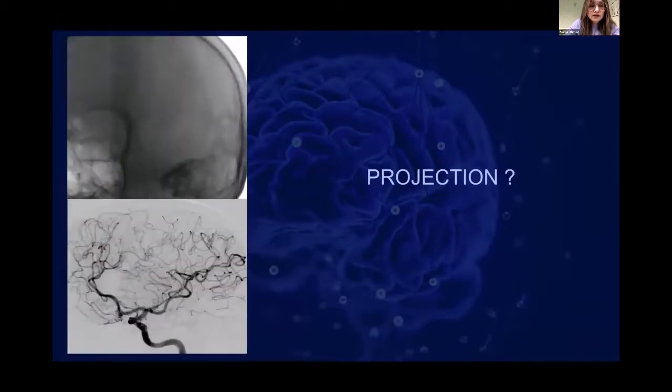So this is another projection. I think this is according to the orbit one can identify what this could be.